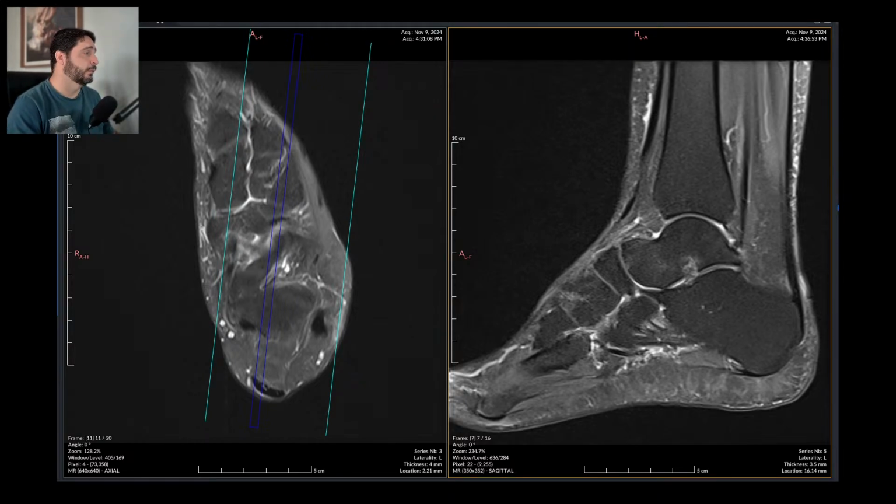So and tiny effusion and edema. And this is it. Let's not waste any more brain trying to figure out whatever this is supposed to be.